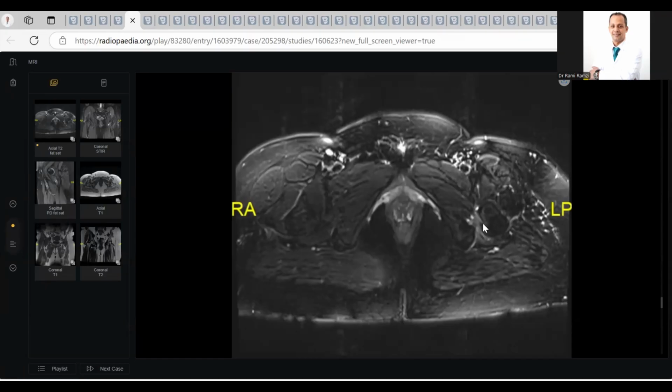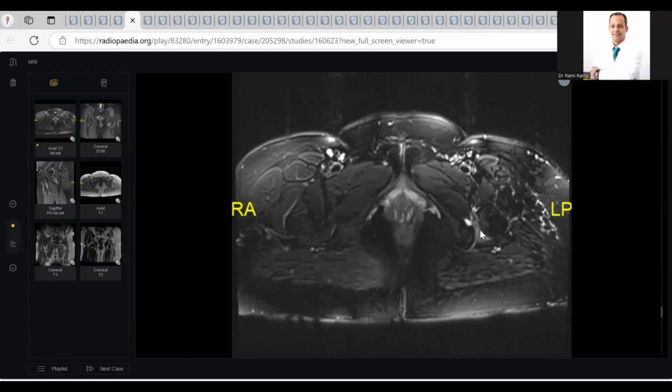If you want to diagnose it, you should measure the distance here. The cutoff point should be less than 15 millimeters. Second point, compare here. The ischiofemoral space here is very good, very wide. By the way, this causes too much pain for the patient. And why do I bring this case?